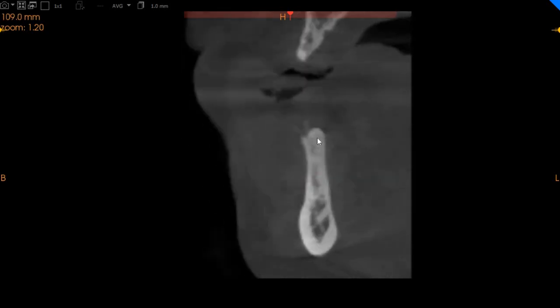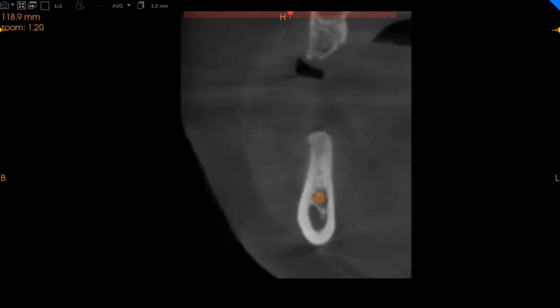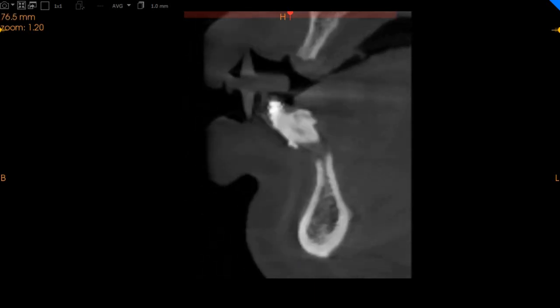Moving to the left hand side, again very thin bone in the lower jaw here. There's 4.5 millimeters, not sufficient bone for implant placement. In the molar region, again slight bit of bone, 4.6 millimeters with slightly more, 12 millimeters, of height and slightly more width inferiorly. So the left hand side has some form of bone, but insufficient bone can be seen for implant placement.